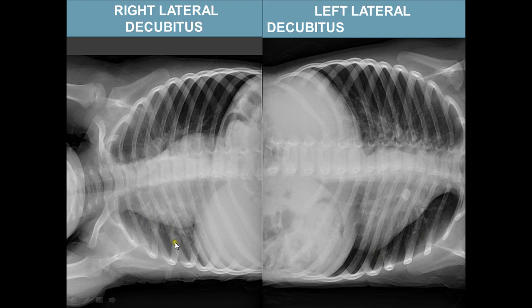Here this is the normal side, where air has been expelled, and this is the normal lung. But on the dependent side, air is being trapped inside. There is a ball valve phenomenon: air comes in and it's not going out, it is being trapped.